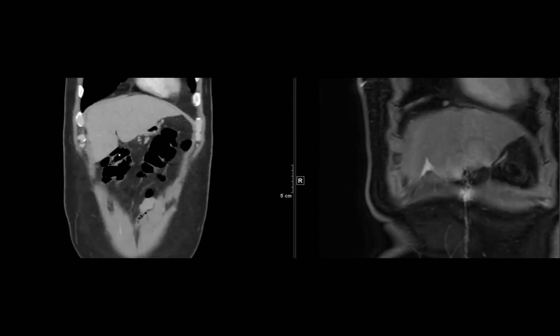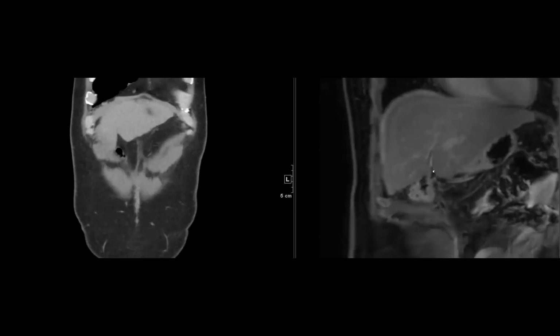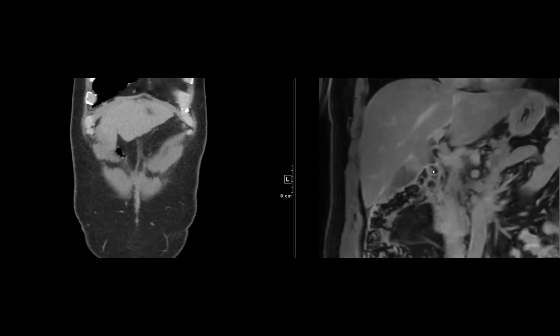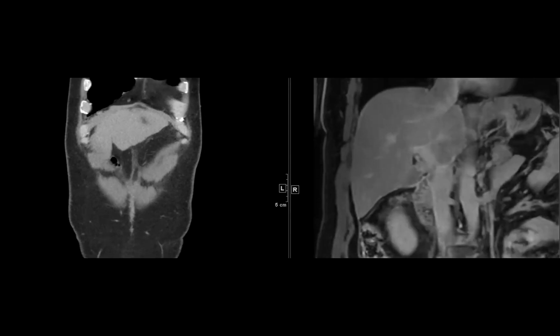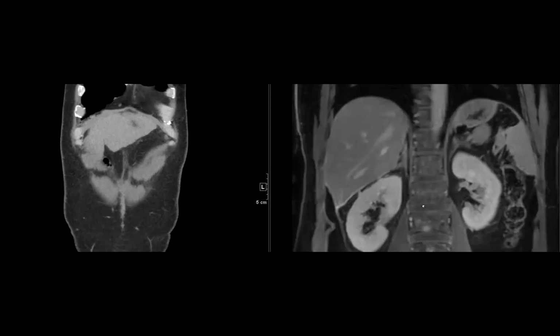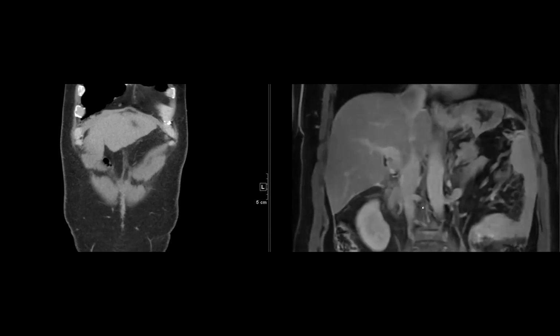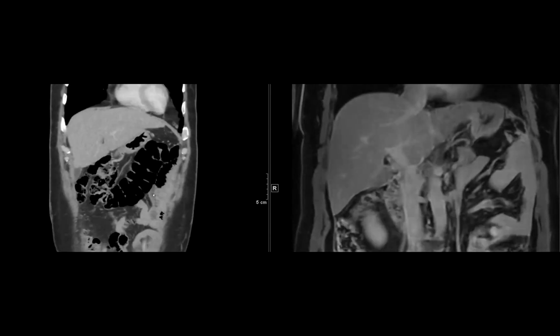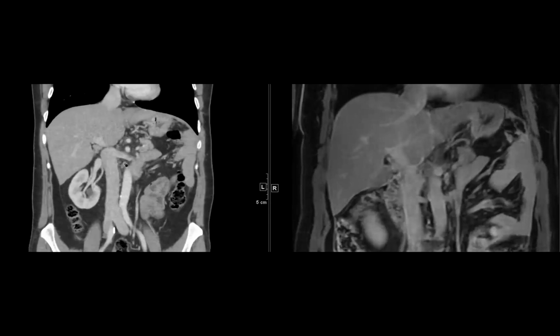So I presume that this capsular involvement is new. Anyway, it's a very unusual, weird case. I assume that the PET scan will be positive, since these are very aggressive tumors, but I actually don't know if they tend to be positive or not. Anyway, that's all I got.